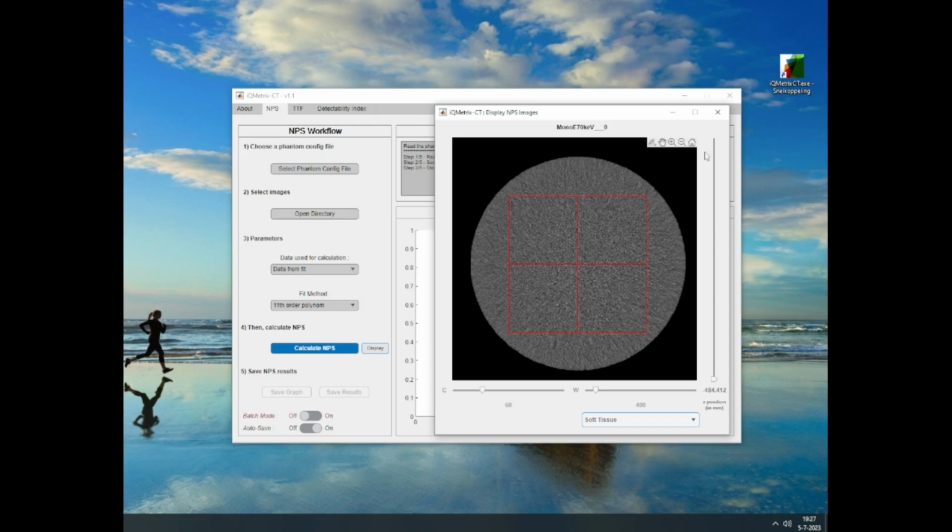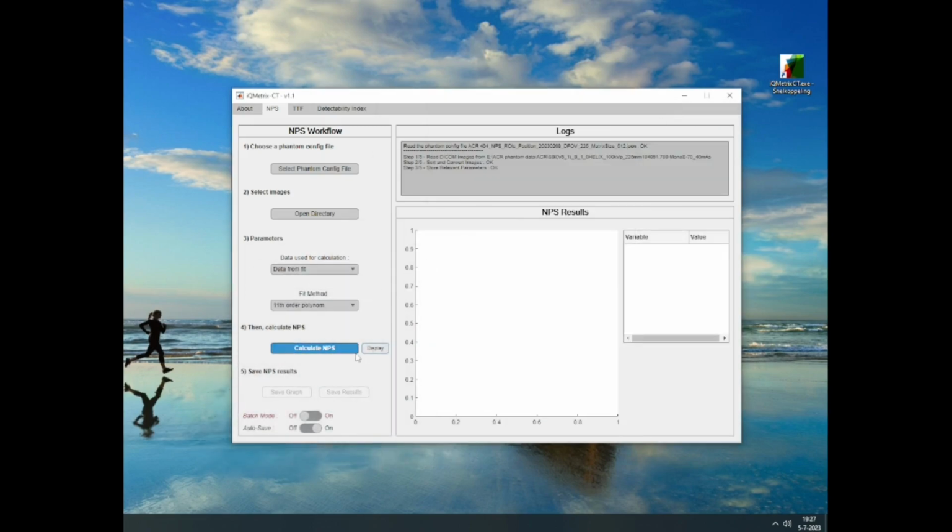So everything here looks fine. Then you calculate it. Did I press calculate?